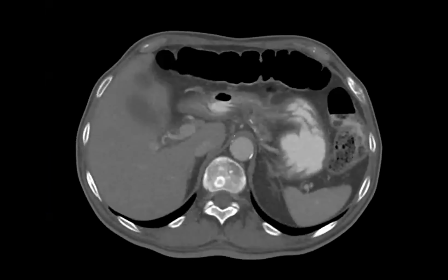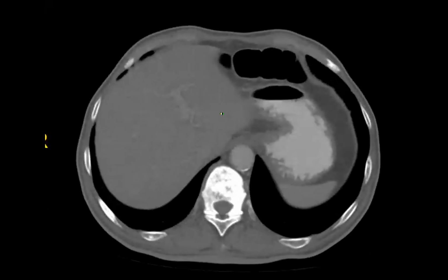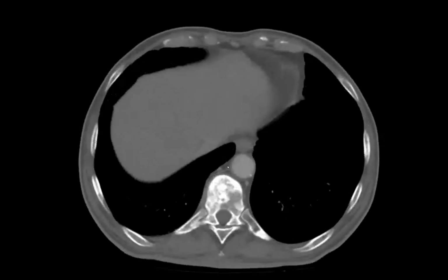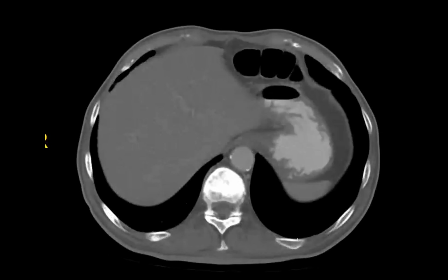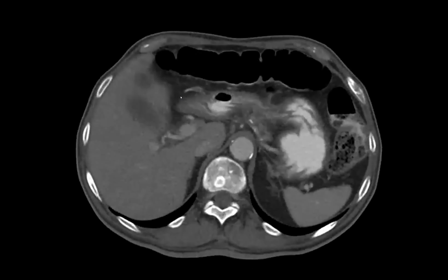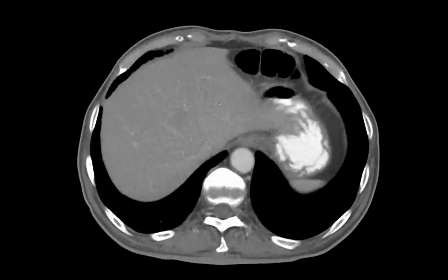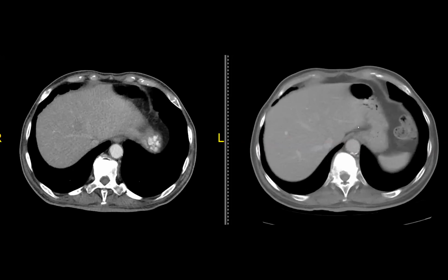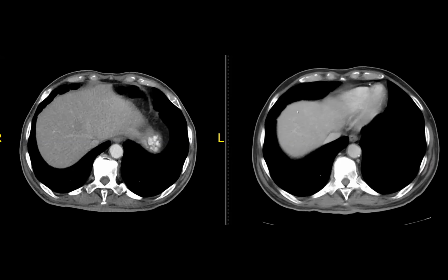Thank you. Okay. A patient with a history of prostate cancer, blastic mets, and failure to thrive was the indication for an outside CT. They said the patient had more liver metastases and more bone metastases than before, which is correct, and everything else they described as normal. So this is subtle, right? You can see kind of something here. Very subtle. And this is the prior, and the patient didn't have anything here.